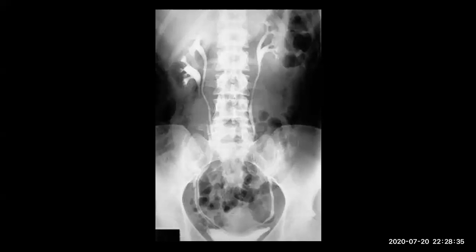If we want to apply the Meyer-Weigert law, this is the upper moiety, and this is the lower moiety.